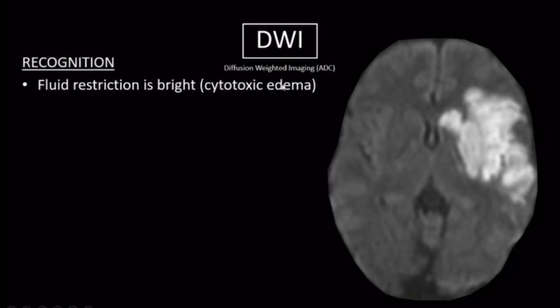Fluid restriction is bright, which stands for cytotoxic edema. So right here we have some bright signal. And what do I mean when we're talking about fluid restriction and diffusion? Well, DWI is basically measuring the Brownian motion of water molecules, and it's helpful to think of only the water molecules in the extracellular space. So when we have an area of ischemia, the cells in that affected area start swelling. That's cytotoxic edema. Because of the swelling, the extracellular space starts to shrink, and that gives our theoretical water molecules diffusing around in that space less room to move around. And so we would say they're restricted.